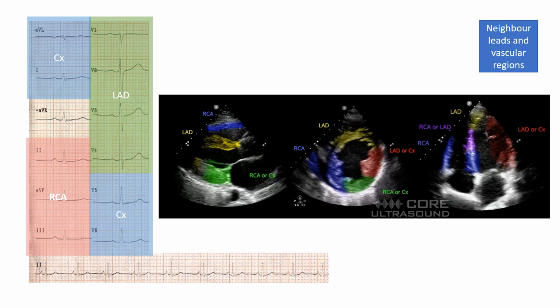But if you look here in the SAX view, the short axis, if you put your finger here on the screen, you may notice whether or not your finger is being squeezed from all sides, and whether or not this musculature is being constricted to 50% of its normal size in every cycle. Or whether there's global axial movement or not. And oftentimes you may, even with novice eyes, see that certain areas of the wall are not moving.